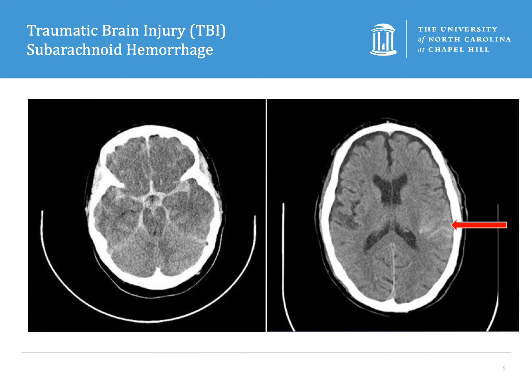On the left scan, you can see this diffuse hemorrhage that looks centrally focused. That's suggestive of an aneurysmal subarachnoid, whereas on the right, in a traumatic subarachnoid hemorrhage, you just see this focal, high cortical subarachnoid hemorrhage pattern.